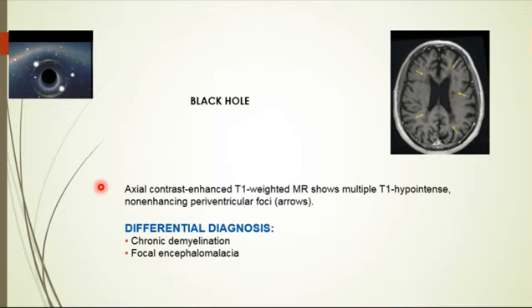Of course, this is much more in favor of demyelination, but as another differential diagnosis, if you like to make another differential. So demyelination, what we mean by that is MS, multiple sclerosis. What the hell is wrong with this computer?